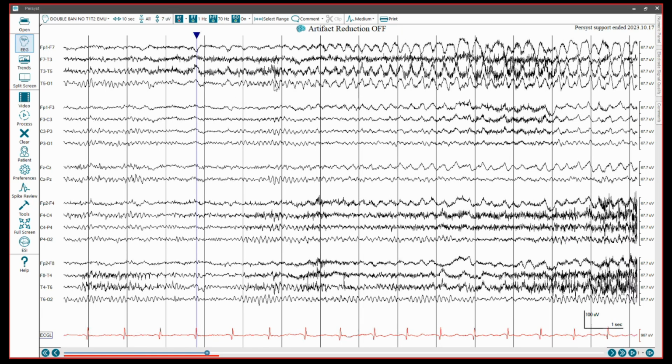However, this is a focal seizure, and note that at this time, the PDR, or posterior dominant rhythm, over the right occipital region is undisturbed. The affected seizure tissue has not encroached upon this region, so it is still humming along.